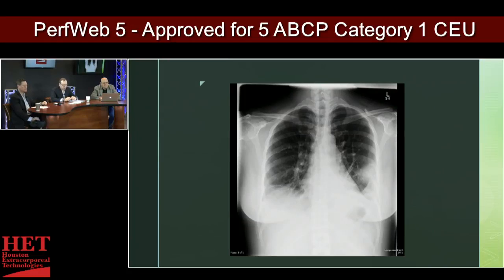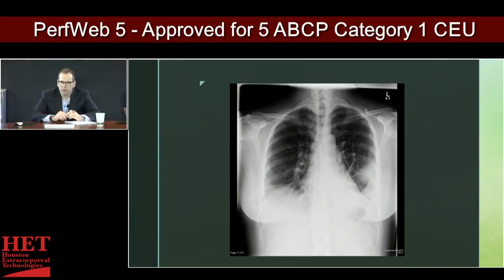And then the lung fields, a good normal exposed chest x-ray should be fairly dark. And when you start to see white areas, whether they're in streaky lines or patchy infiltrates or wedge-shaped defects, then that would indicate some sort of pathology. And you obviously have to tie that into the clinical picture. You never want to jump to an assumption, and you always want to take it in context of the patient that you're looking at, because some of these processes can look the same if you're just looking at a plain x-ray.